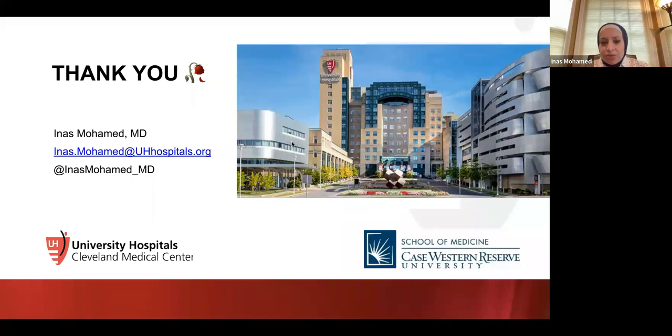Sometimes patients who went for ERCP or cholecystectomy have a fluid collection in the gallbladder fossa, and they want to know if this is bile or not. We give them EOVIST, and if that collection has contrast in the hepatobiliary phase, then it's definitely bile.